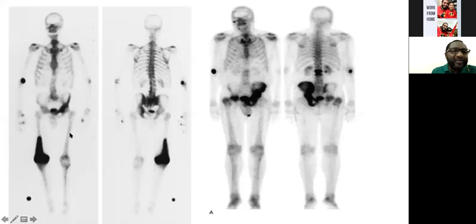And again, the age of the patient is one of the things that you consider. If you look at all the other patients that I've shown you in the previous slides, most of them are young individuals. This is a patient with documented Paget's disease, but in addition to that, there is also affectation of the left hemipelvis. So there are two areas of disease that are seen. In this second patient, again, you can see there is this intense uptake associated with expansion of the bone and deformity. So the key point to note in patients with Paget's disease is once you look at the scan, you will see that the bone uptake is intense, so intense, and then there is expansion of the bone, and oftentimes, depending on the bone affected and the stage of the disease, there will be some form of deformity.